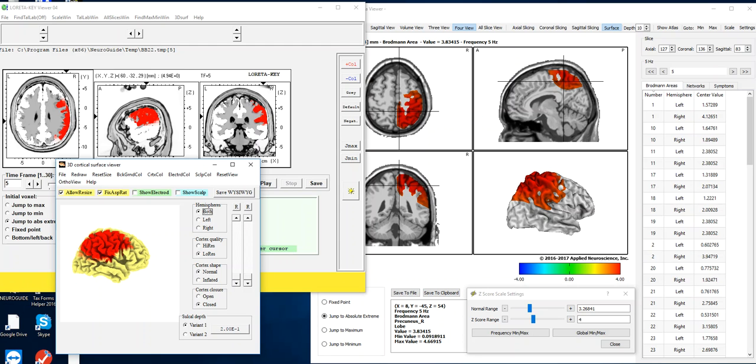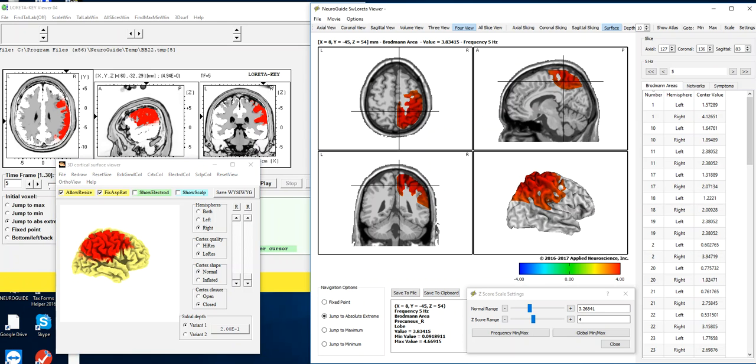Institute? Like if I click right hemisphere only in the Key Institute, you'll see the mesial surface, and then you'll see that there's a projection to the outer surface on the lateral side of the right hemisphere. And in swLORETA, here's the volume, and you can see that it's normal on the left, just like the Key Institute.